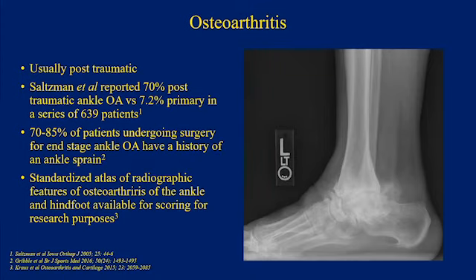These are AP and lateral views of the ankle in a patient who has severe post-traumatic ankle joint osteoarthritis, marked subchondral sclerosis, exuberant bony proliferative changes both anteriorly and posteriorly. Probably if we did flexion extension lateral views, there'd be very limited motion at this ankle. Next.